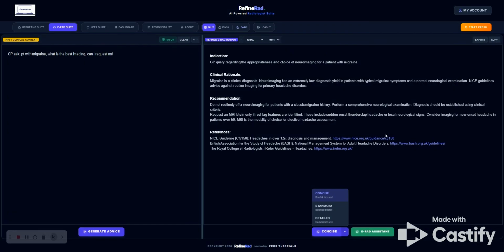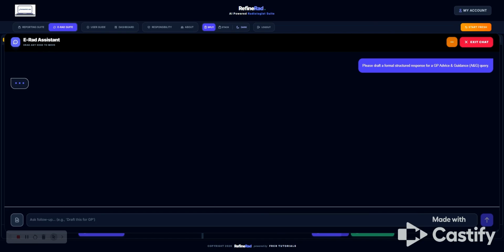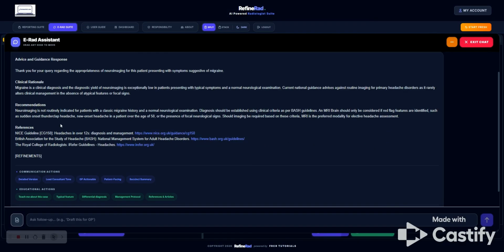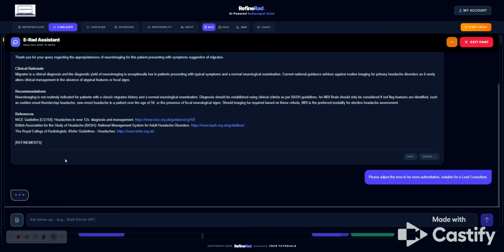So it's fantastic. And then you have an eRAD assistant similar to the RAD assistant you had in the reporting suite. If you click on that chat model and you want to give the GP formal advice and guidance, you just click on that, draft a formal response, and it will draft you a response. Okay, and then say you want to put this in a more lead consultant tone, so you can change the tone. So put it in a lead consultant tone.